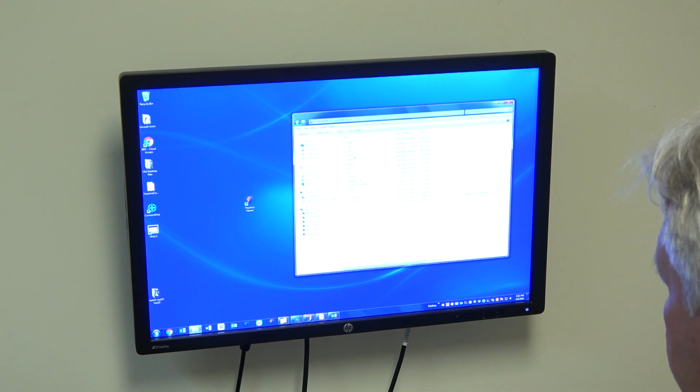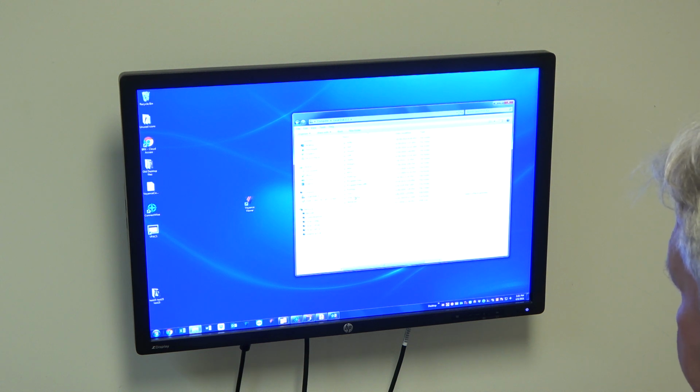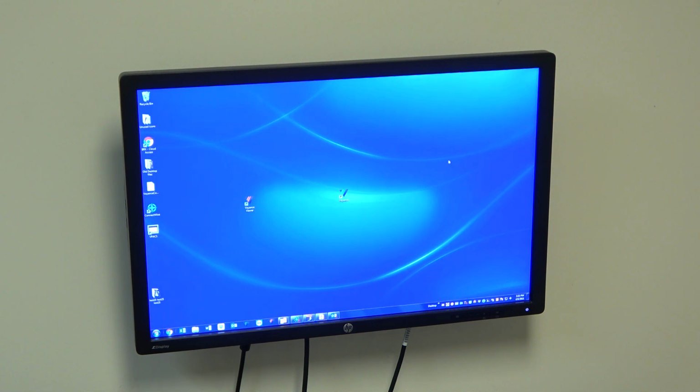In a BRX, we typically have a BRX or a Voyance folder in here that has the version of software sitting in there as a file. We could take that file, put it on a thumb drive, and then take it to any of the computers on the network that have a PC. You cannot load it on any of the tablets right now. It has to have an operating system, preferably Windows 10.